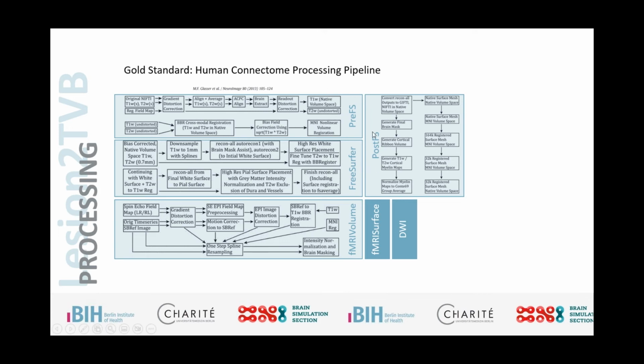So all of the other processes are aiming at processing the corresponding modality into the same T1 space for the specific subject. A lot of this is a very simplified version or representation here. A lot of this is happening iteratively. So even, for example, if we're looking at the brain extraction, this is happening iteratively. There's an initial brain mask based on an MNI template.